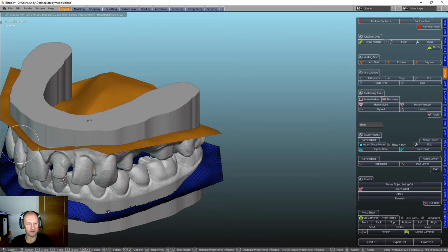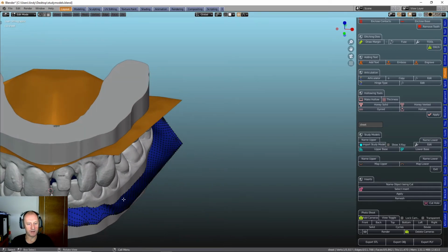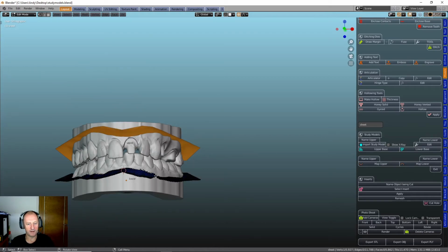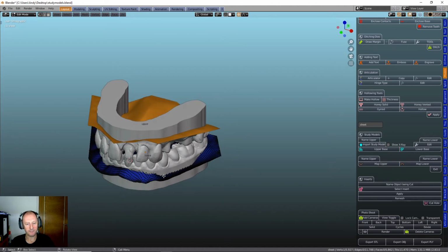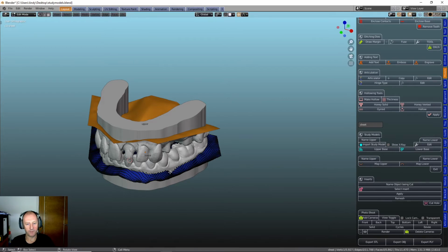So, oh no, sorry, we don't do that. I'll just highlight that, grab that. And this is what I meant about having enough space between the model and the edge. If this is very small, you start to move the nicely formed edge of the base if there's not enough vertices there. Anyway, we'll whip round this bit, bring those up.